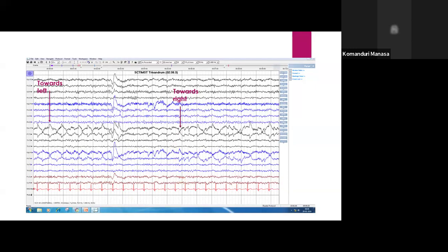What are those sharp transients typically? These are lateral rectus spikes, which are seen with eye movement. Sudden eye movement will cause the lateral rectus artifact, which can be seen along with the myogenic artifacts from the lateral rectus muscle.